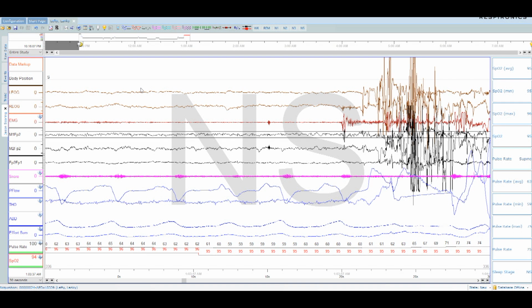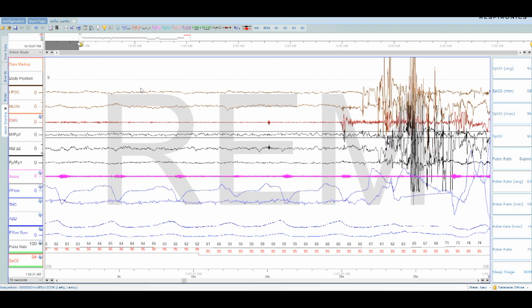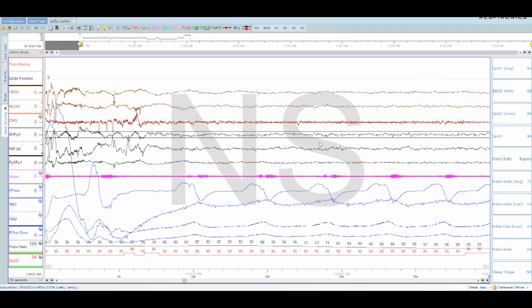But as we move along, I wake up here. We'll look at why I woke up later. That's not for now. But look at this chin. The chin is really low. It's like a little pencil. As I wake up, my chin tone comes back. It gets much larger. I'm going to advance forward. And now I'm back to sleep here, but my chin tone is still elevated. So that's pretty interesting.